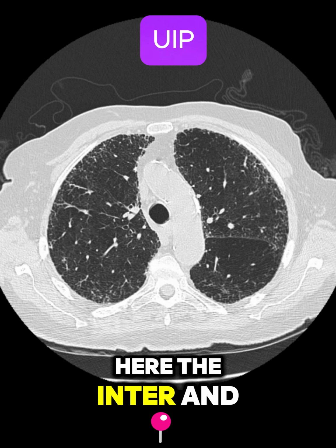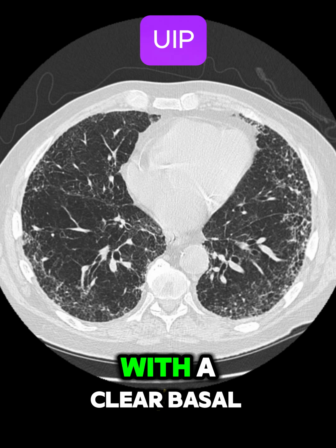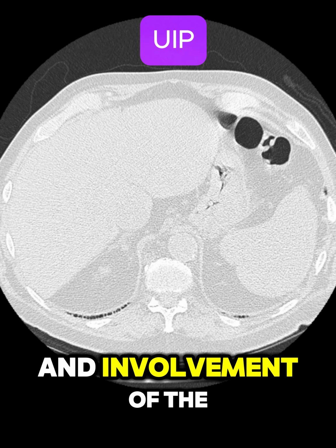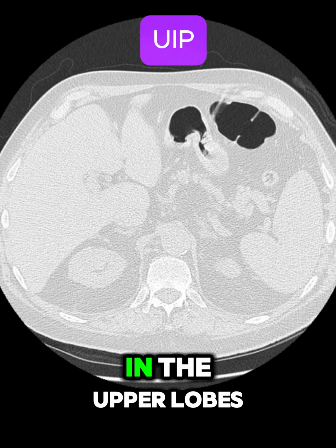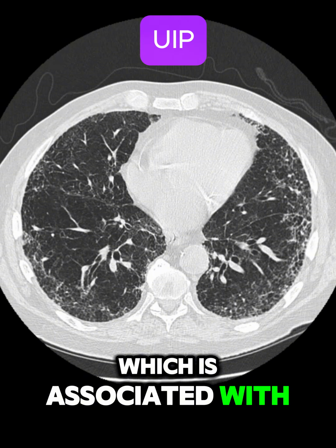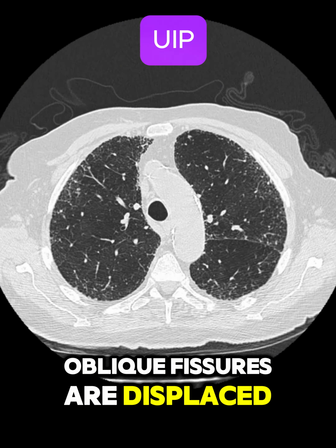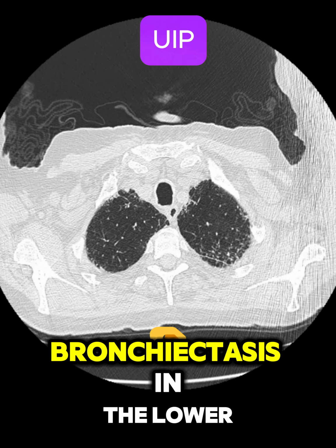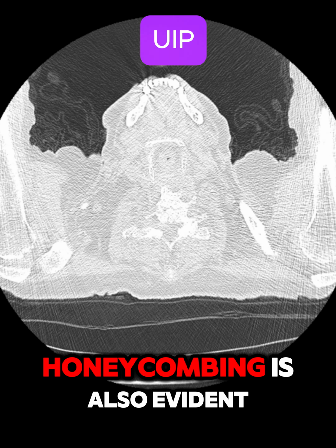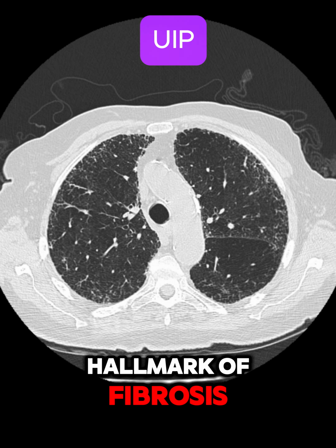Here, the inter- and intralobular septal thickening really catches my attention, with a clear basal predilection and involvement of the anterolateral periphery in the upper lobes. There's volume loss in the lung bases, which is associated with architectural distortion. I can see the oblique fissures are displaced, and there's traction bronchiolectasis in the lower lung zones. Honeycombing is also evident in the basal regions, which is an important hallmark of fibrosis.